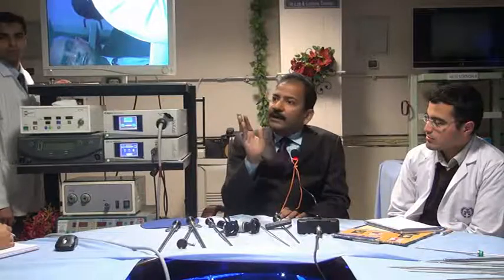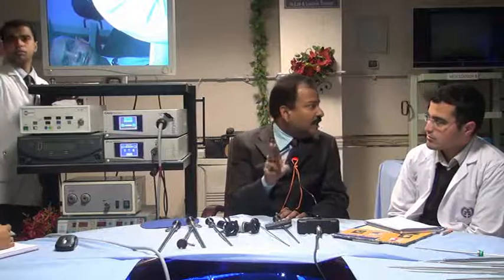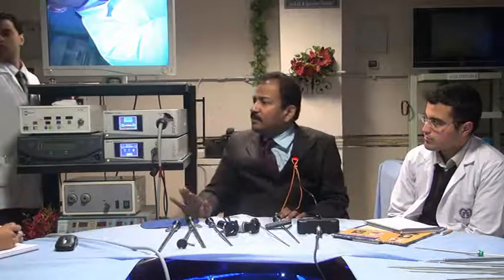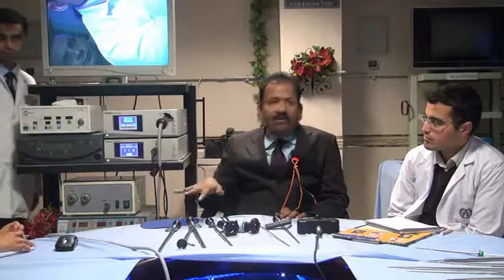In a 3-chip camera, red doesn't enter into blue and green. Red can only go to the red. Blue and green, they stop. It doesn't matter how strong you are, how obese you are, please don't enter this compartment. This is reserved for green, this is reserved for blue. So red doesn't show its power in the green and blue compartment.